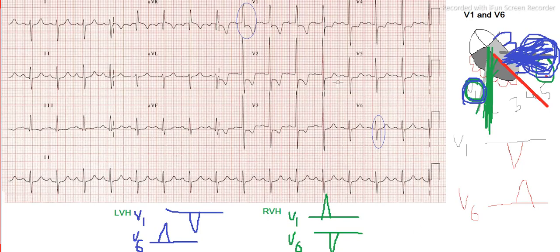Again going back to that figure, when we look at right atrial enlargement, it's not quite clear, but when you zoom in it could be visible, I hope so. So you see here the P wave, it is like a tall P wave, but it's not clear. But what we can do is find the axis here. So to find the axis, I will draw lead 1. So this will be our lead 1 here.